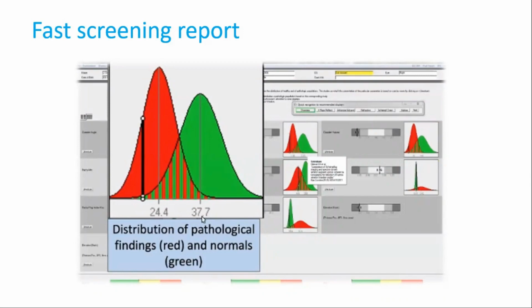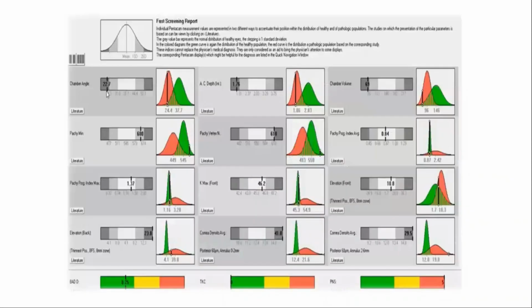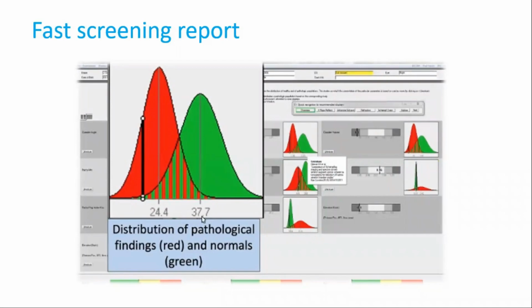If it was on the extreme right dark gray zone, what would it signify? Instead of being on the extreme left dark gray zone, if it was 2 standard deviations to the other side, what would it signify? I know it would be abnormal, but what would it mean? Because it would probably be beyond the green zone, right?